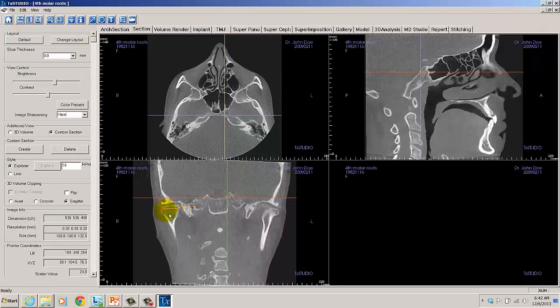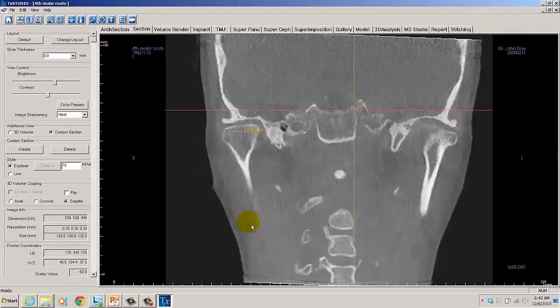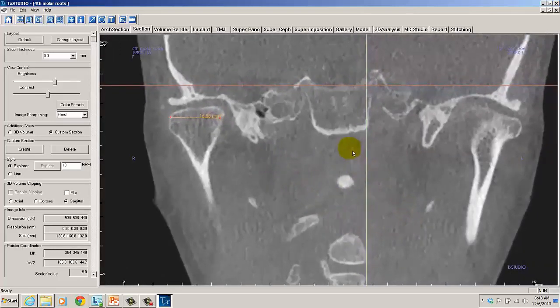Now, while the measurement looks like it might be fairly accurate from this point of view, it's very helpful to bring the area into a larger field of view by left mouse clicking this time. Let's use that tool, and we bring it into its own window. We can see that maybe we would like to move our measurement line to a different location. Let's further enlarge this by holding down the control button and the left mouse button again, and enlarge.